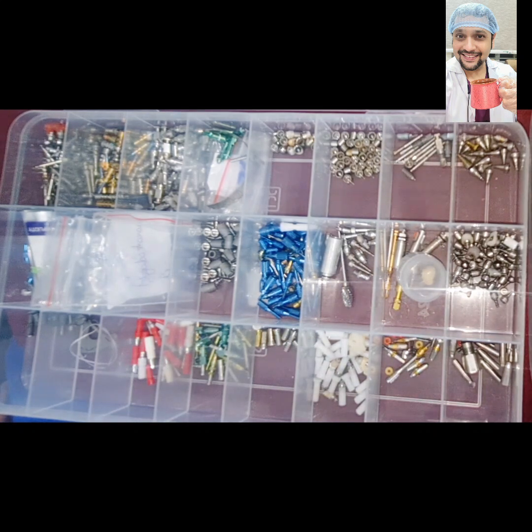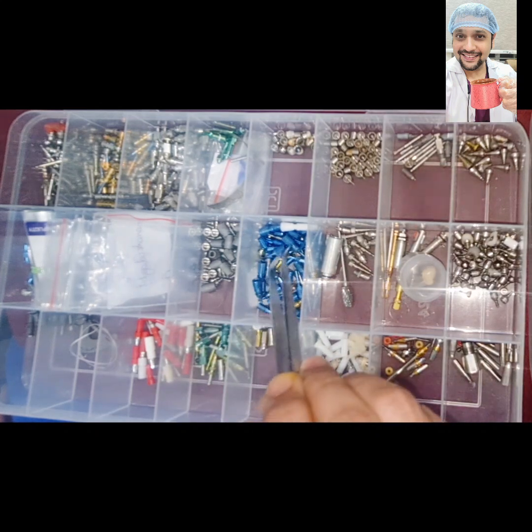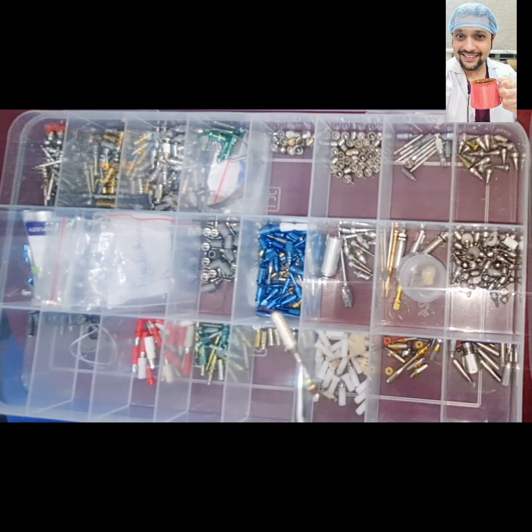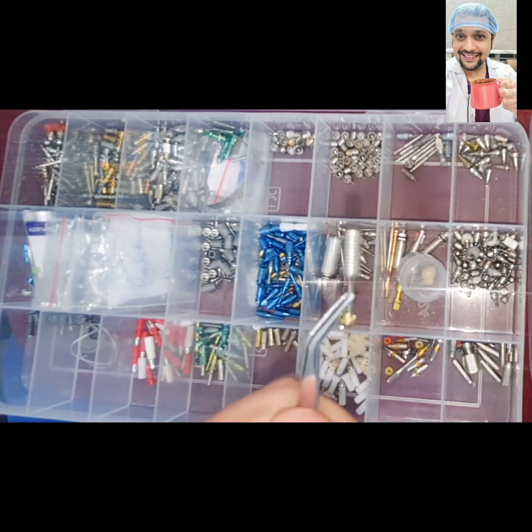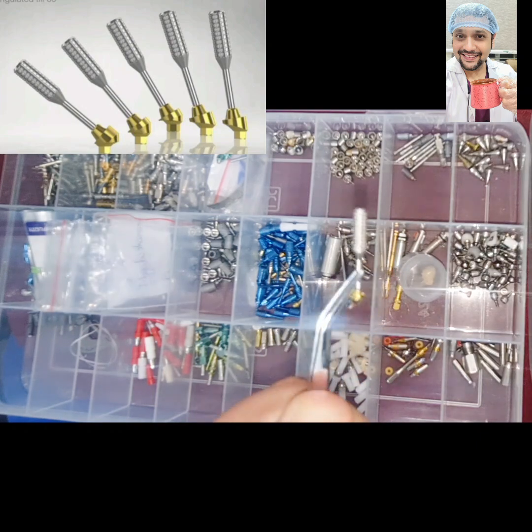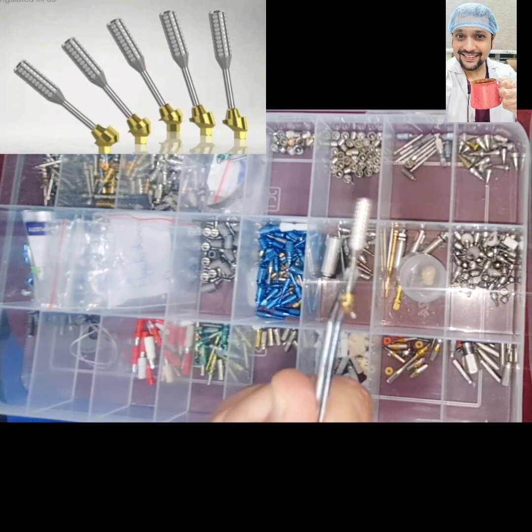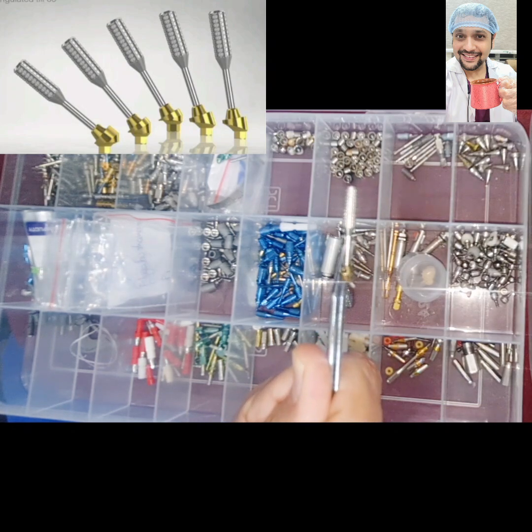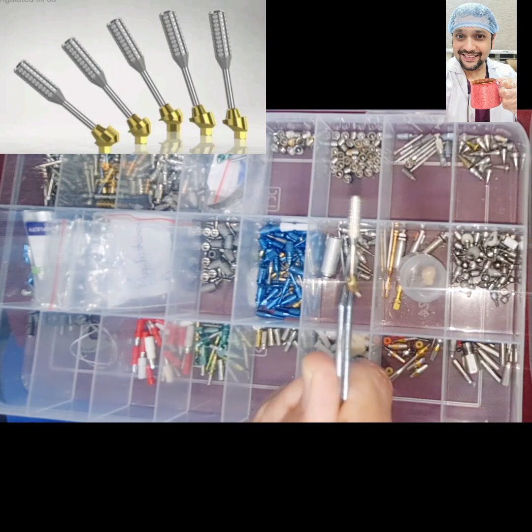Now coming to the next concept, which is known as multi-unit abutment level. These are known as multi-unit abutments, which you see in the video now. If you see here carefully, you have a carrier or a positioner which will take the multi-unit abutment into the implant. The angulation of the multi-unit abutment here is different, and the way it goes into the implant is different. So it has 2 angulations, one into the implant and one into the prosthetic platform. That's why it's called multi-unit abutment.